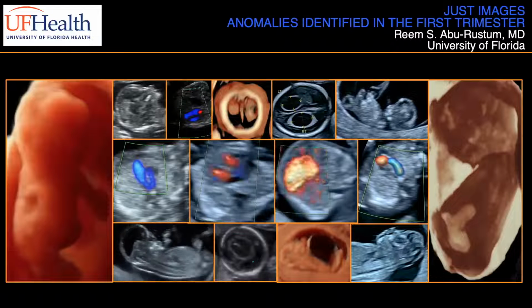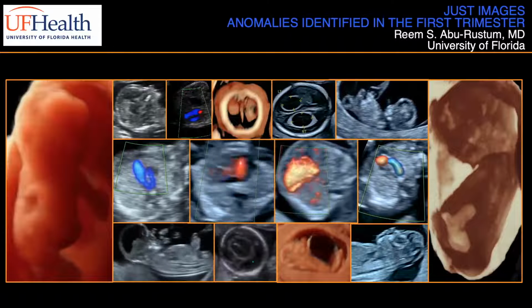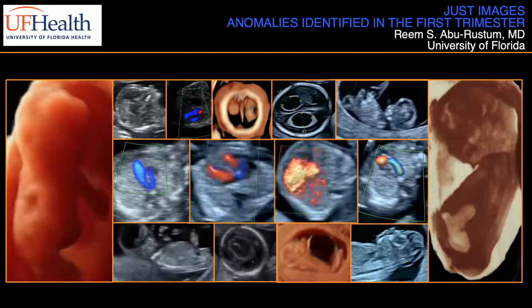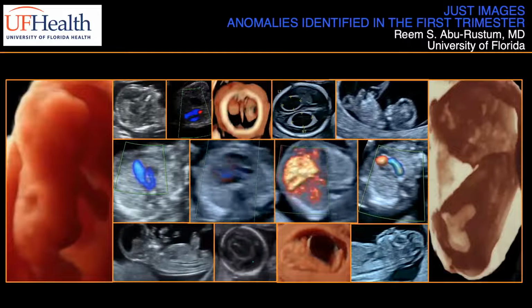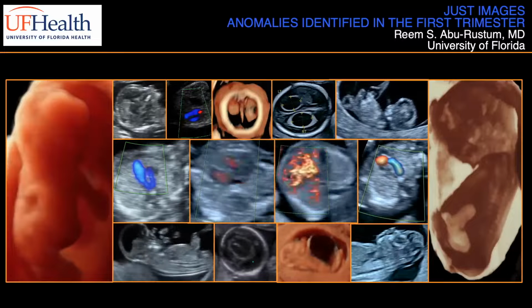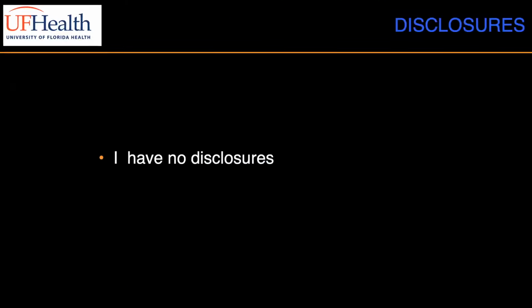And as it comes on the last day, I have chosen various cases representative of many organ systems in what's going to be just images to highlight some anomalies that potentially may be detected. And so, as I will show each of the cases, try to configure what you feel the underlying abnormality is, and then I will be revealing the diagnosis.